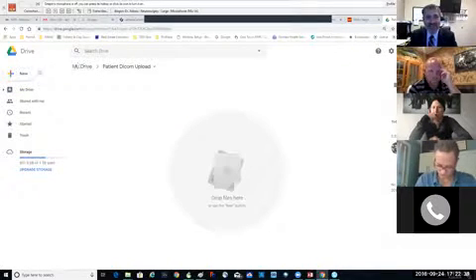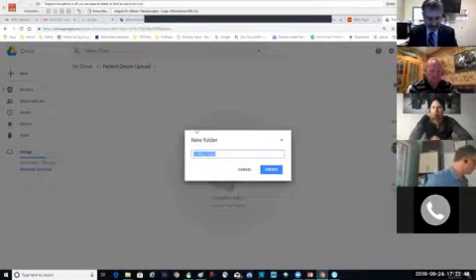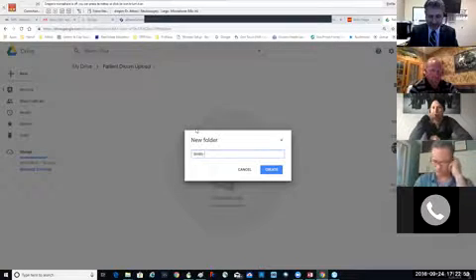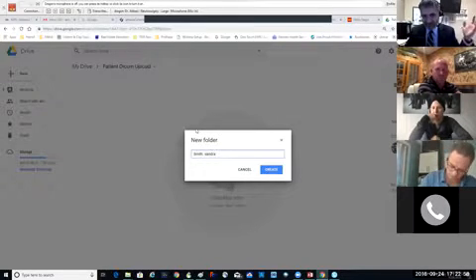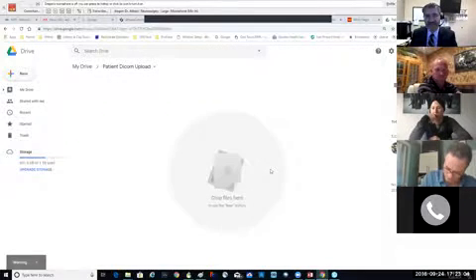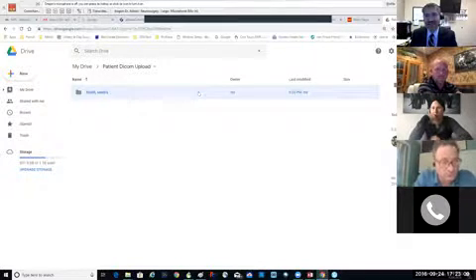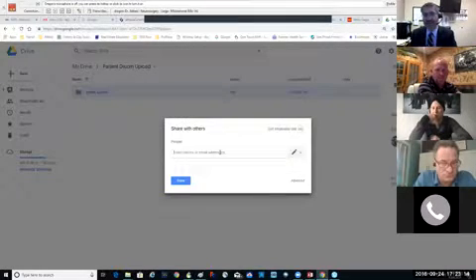Now I'm going into patient DICOM upload. Let's say the name of that patient is Smith. So I go in that, I make another folder. I call this Smith, comma, space, like Sandra, just a random name. I'm just doing that to show you. Create. Then look at what I'm doing. I mark it, I right-click, and I share it with Sandra.